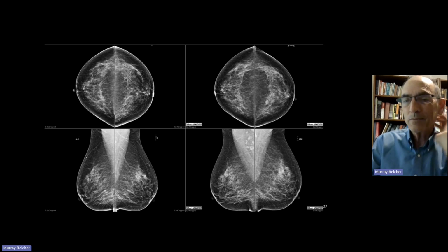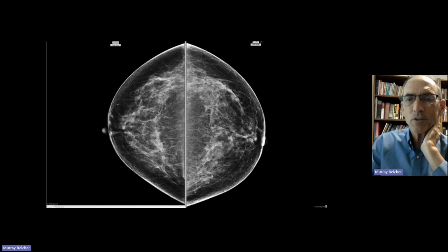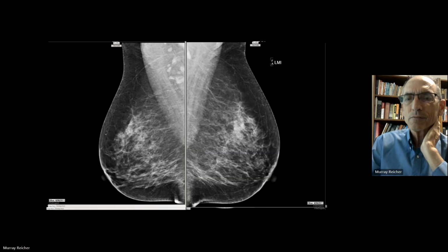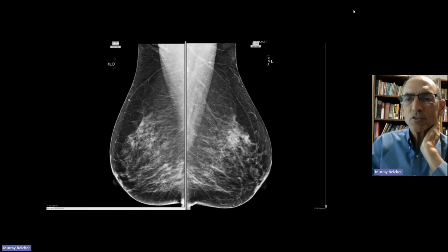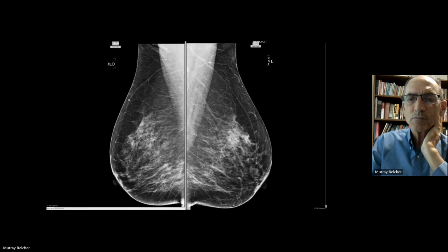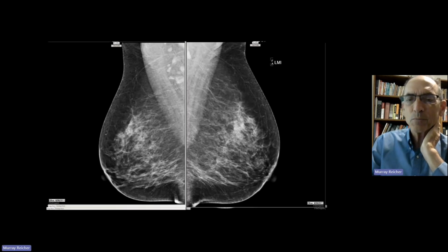Mammography, we've been looking at them side by side with 6, 8, 10 different hanging protocols for every case. Isn't it better if you can flicker between them? See the lesion jumping off the page, even though the images are not registered or not fully registered, they're partially registered.